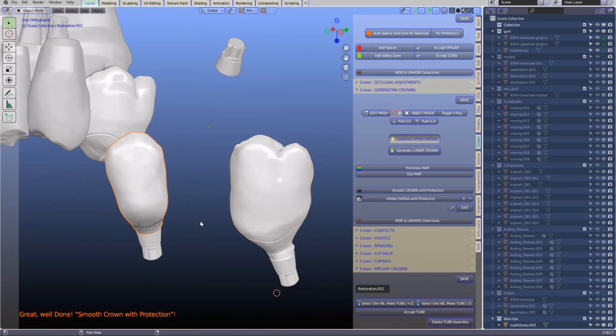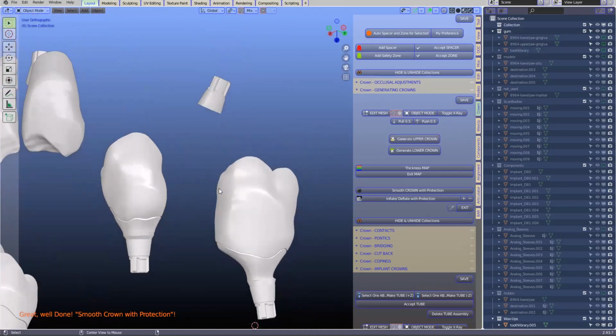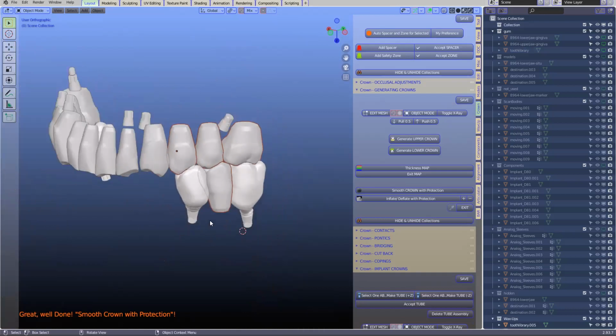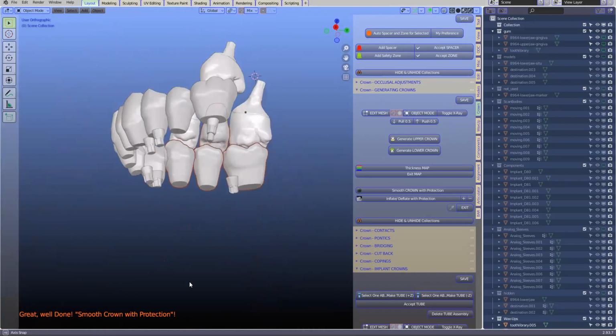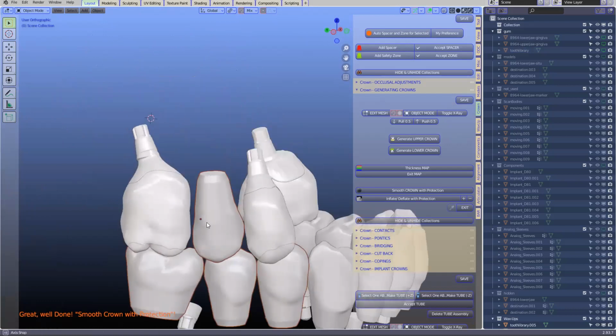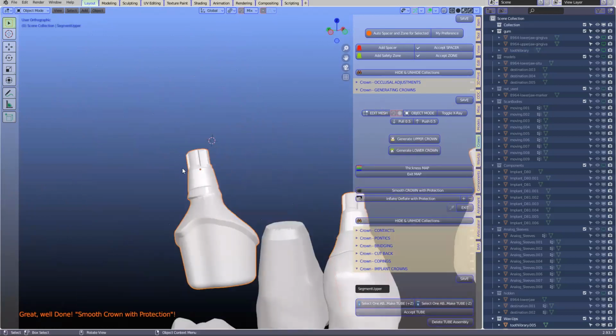Michael, just a question. With the Medentica implants, would you be able to bring in a pre-mill, or am I going to ambush you with that? Just to see how the cylinder fits over. Okay, you've ambushed me because I've deleted the spare one.